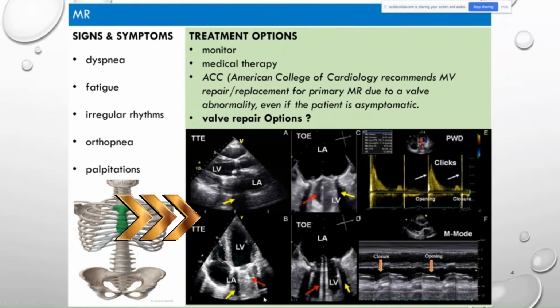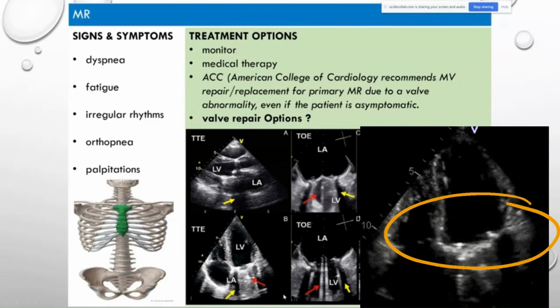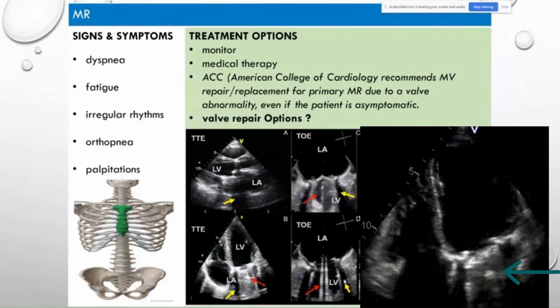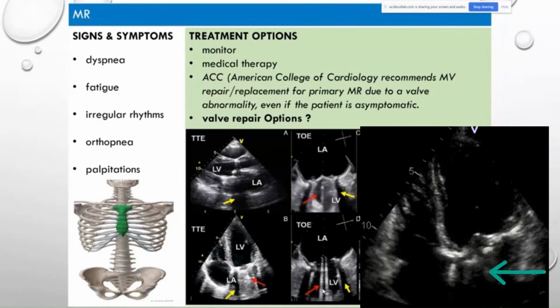So this picture right here, you guys have not scanned enough yet to see this, but like I said, this is a mechanical valve. So this is a replacement of the mitral valve, and this is the normal appearance. And you're going to have shadowing and reverberation, which is what this is. You're going to want to know reverberation for your registry. This is what it looks like.